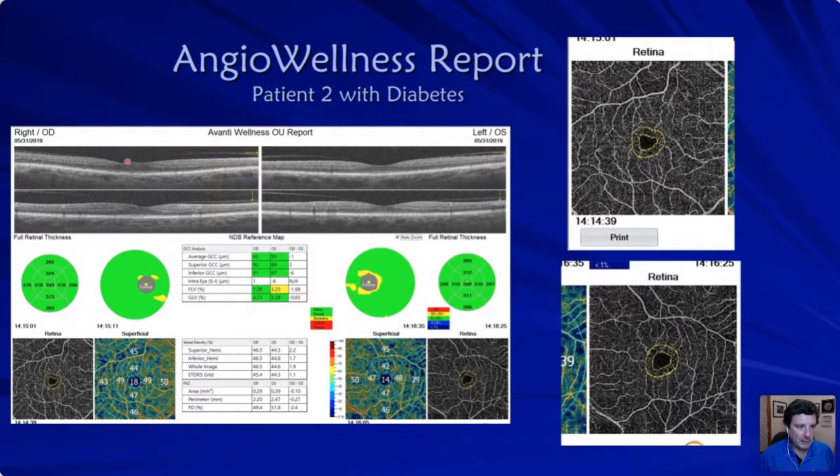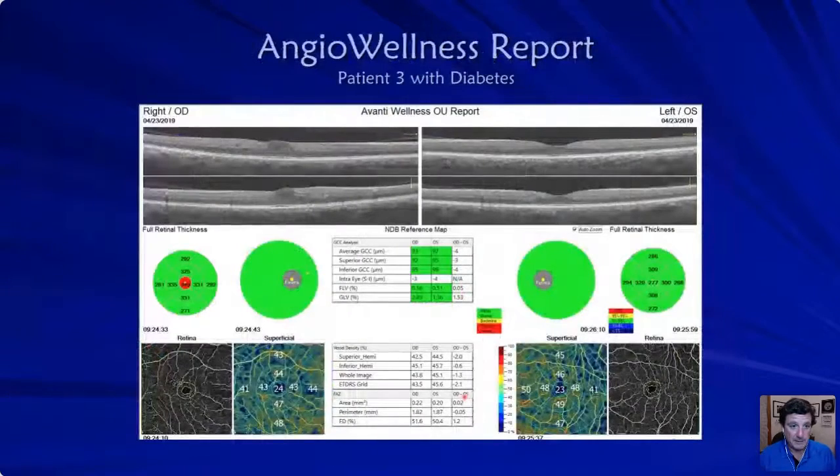Being a geek, look right here. Vitreomacular traction in this eye, right? Vitreomacular adhesion. Oop, it's distorted. Vitreomacular traction. Look at this one. It's kind of hard to see. This would be a broad-based vitreomacular adhesion. This would be a focal vitreomacular traction with diabetic retinopathy in both eyes. And that's how I bill it. I bill it as diabetic retinopathy, and we follow the patient back.